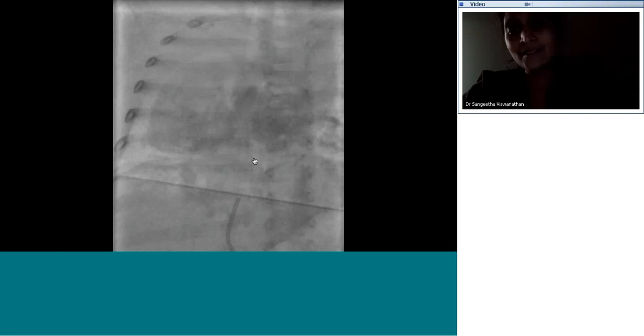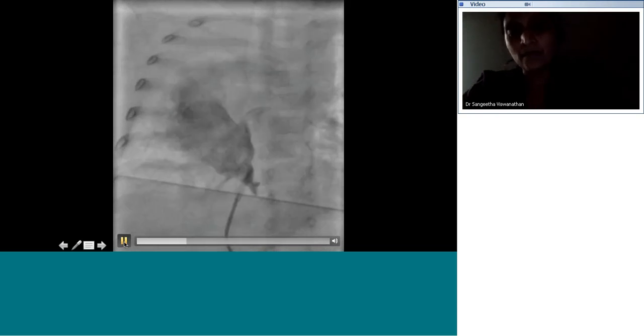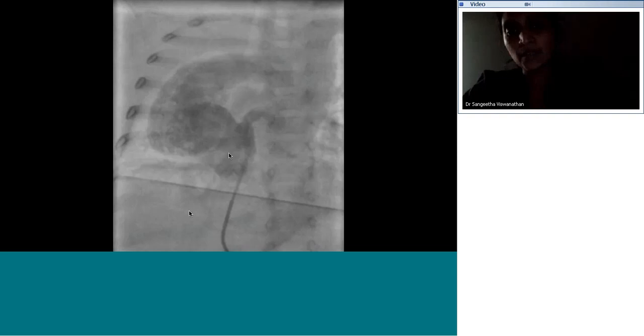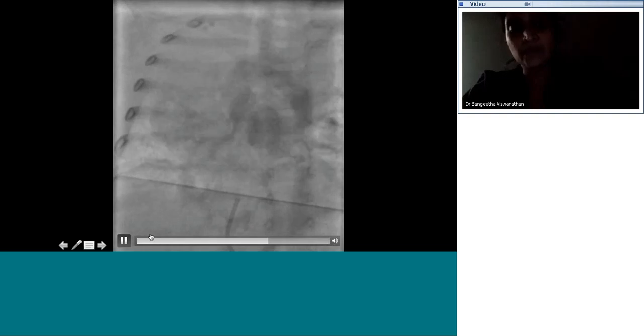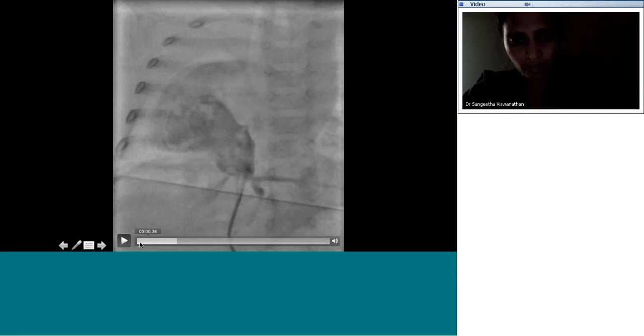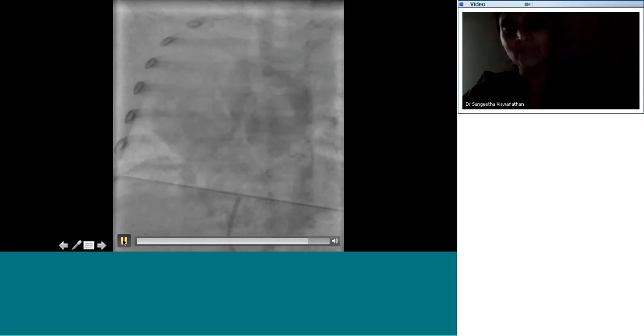Okay, so this is a slightly complicated angiogram. Patient has quite a rotated heart. Basically, where is the injection being performed? Correct, distal anastomosis. So yeah, where is the injection being performed here? Appears to be an end-hole catheter. Can't be sure though. Yeah, it is an end-hole catheter. So must be a hand injection. This was a small, so like a neonate, a small baby.